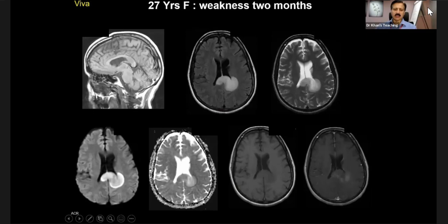there will be a large lesion and you will confuse it as a tumor. It can occur anywhere. But look at this case. The corpus callosum is involved. If you see there is a rim of restricted diffusion, and classically they say that active inflammation is towards the white matter, and towards the gray matter, which is this side, there will be less active inflammation.